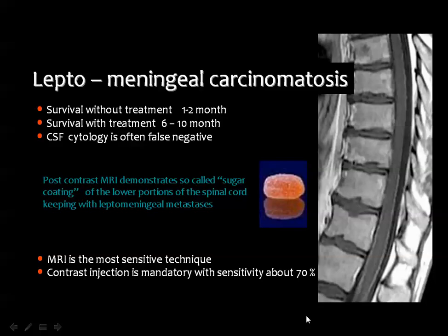This leptomeningeal metastasis or carcinomatosis is a lesion that is frequently seen in clinical practice, especially in patients who have pathology in tumors in the CNS, and also this can occur from other lesions outside the CNS.